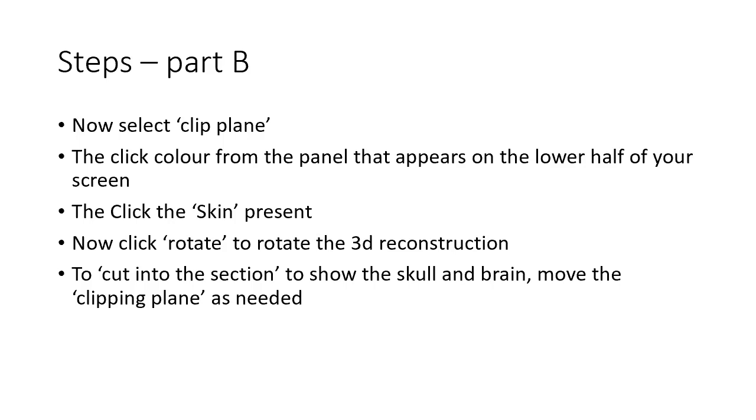And then after that, I used the clip plane to clip from the top towards the bottom to see the ventricles and to see the relationship of the lateral ventricles to the ear.